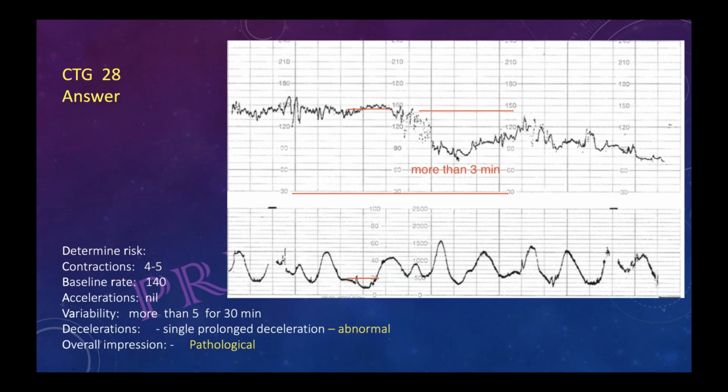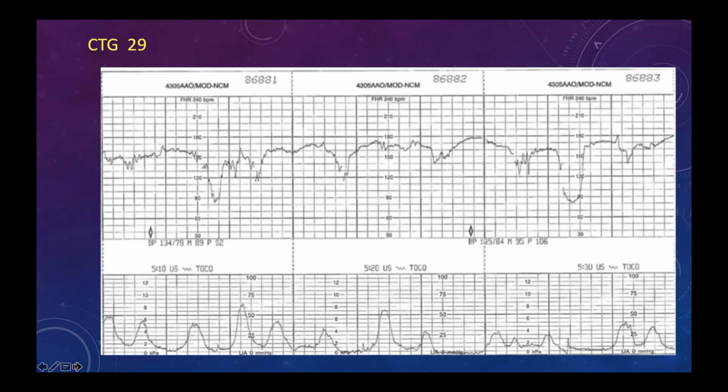Okay. But here there is a shift in baseline also, correct, ma'am? Yeah. If abruption, rupture, or cord prolapse, some emergency had happened, then this type of picture comes. And these are the easiest traces, because anyone looking, if the sine wave is coming or if a single prolonged deceleration is coming, these are the easiest. Okay, who wants to try?